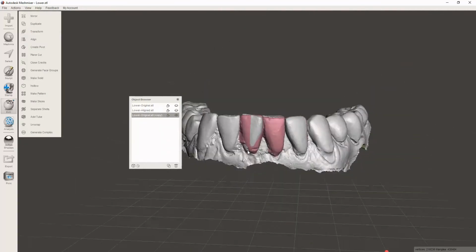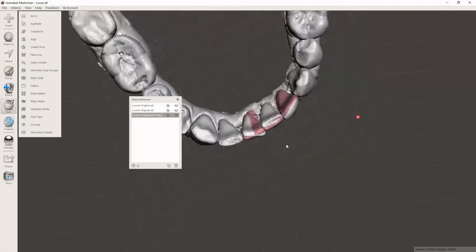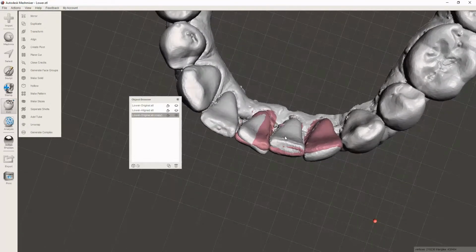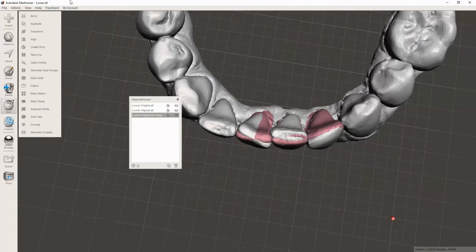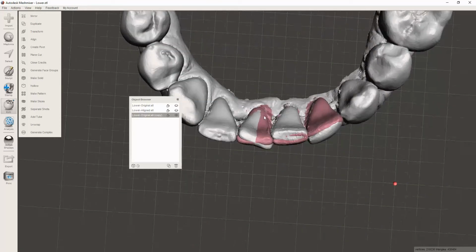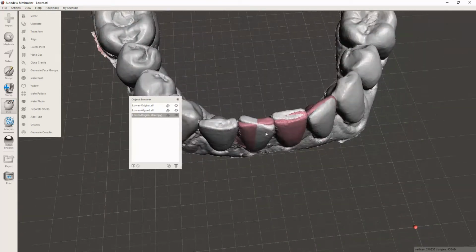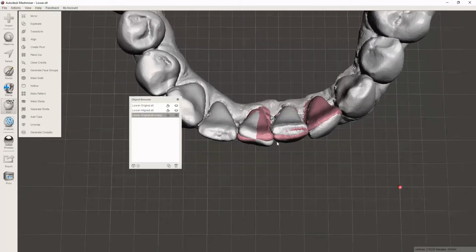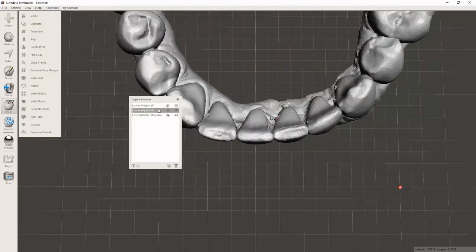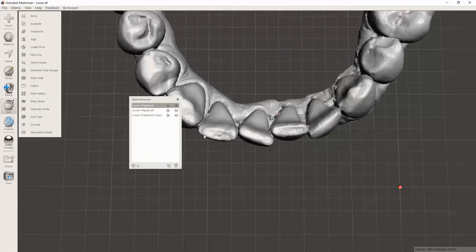It changes, you can see the different colors in this model because it's just kind of showing you the surfaces, but they are not distinct parts. They are just kind of mapped out for you, which is actually nice because now if you were to print this off, I don't mean a 3D print, but print this picture right here, you could attach it to the patient's chart, and now you know where you're going to place buttons, little dimples with Essex style pliers, one that's going to push the direction here, one that's going to push here, and then one that's going to push through the gray there, and one that's there to help advance this tooth into ultimately the purple position. So now you can see here's your combined model, here's the ideal model, and here's the beginning.